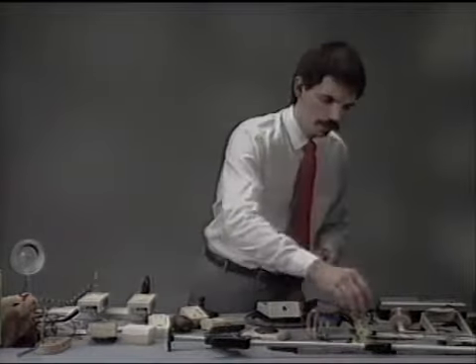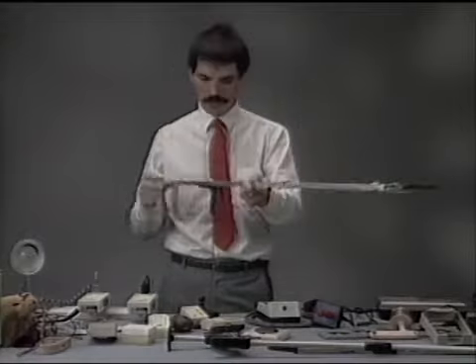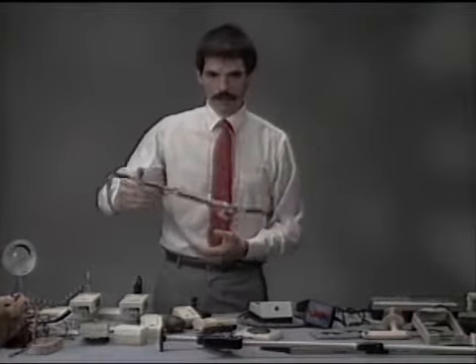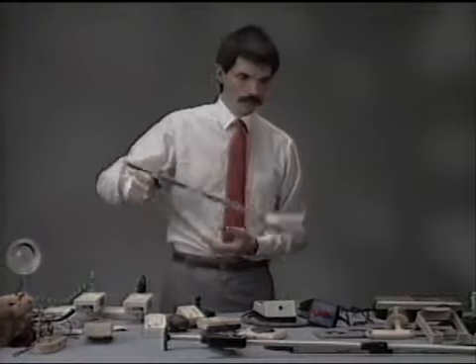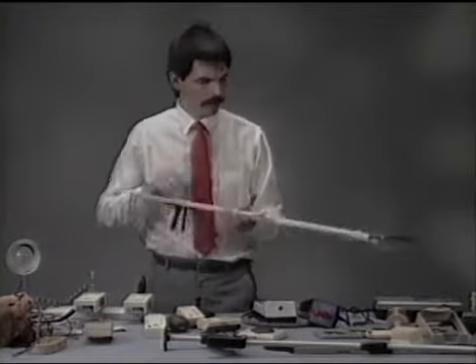Now those two both work in an up and down motion. This one here opens up and works on a side-to-side motion. It also gives you a lot of support in your wrist here, so if you can't operate it as easily, you have something that you can support it with, and now I can pick up something and put it down and do quite a bit of work that way.